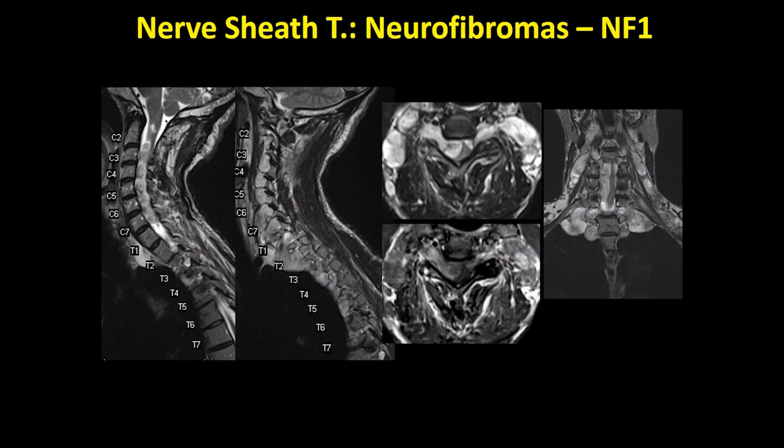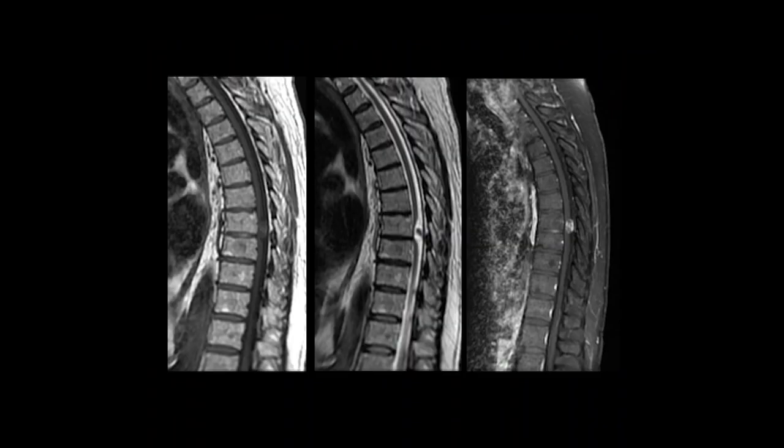Diagnosis in this particular case: multiple neurofibromas associated with NF type 1. As against that, there is an enhancing lesion seen here in the spinal canal. It displaces the cord ventrally, does not expand the cord, so it's not intramedullary in location. It does not efface the extradural fat, and therefore it's not extradural in origin.